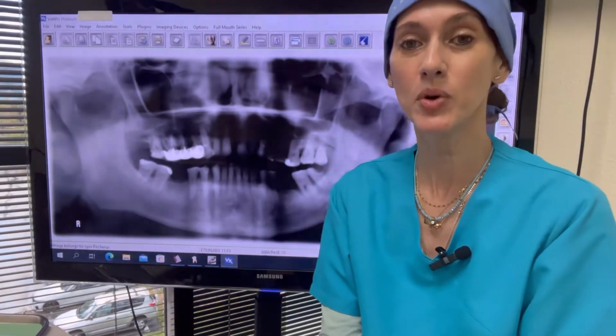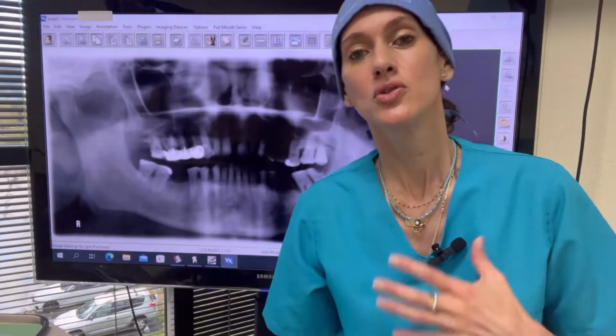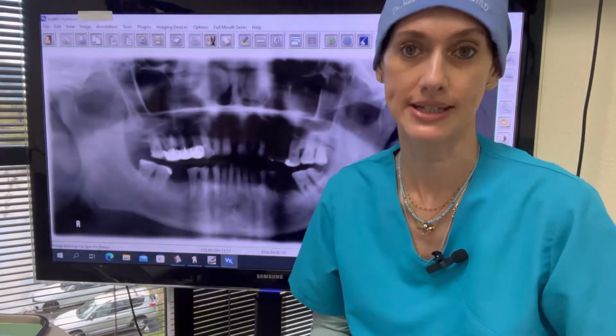Hello everybody, I'm Dr. Valeria Soltanik and I'm going to go over patients' x-rays to explain a little bit more about the cases and what we find on an oral exam.